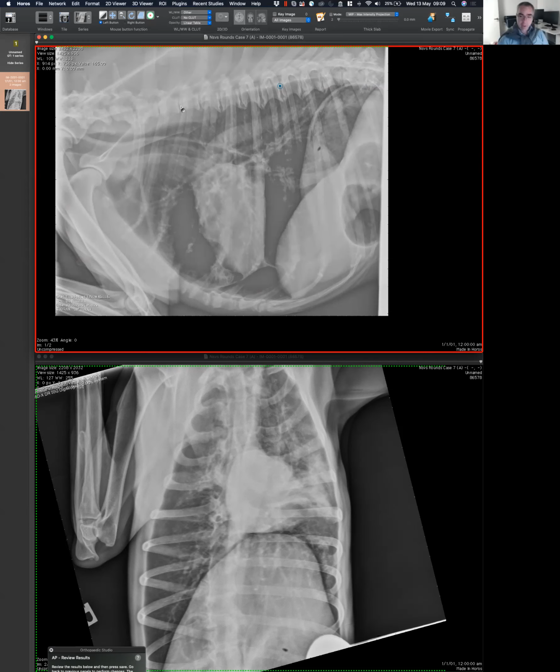You mentioned another thing, that you can see the lung extending all the way to the periphery. So that's also a very good thing. So the lung seems to extend to the periphery. Then something else that you mentioned was that the heart seems to be elevated. So another very important thing: elevation of the heart. Can I add, I think the heart silhouette looks very small. Okay, good point. Just subjectively. Small heart. Okay.